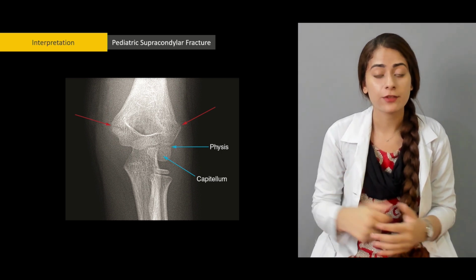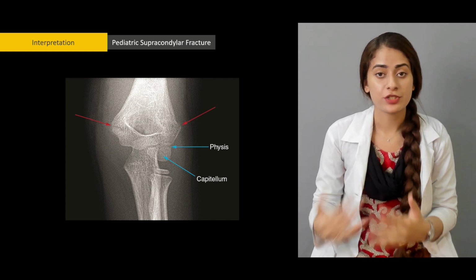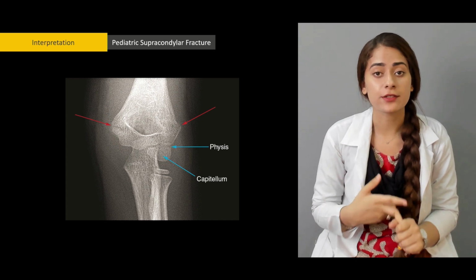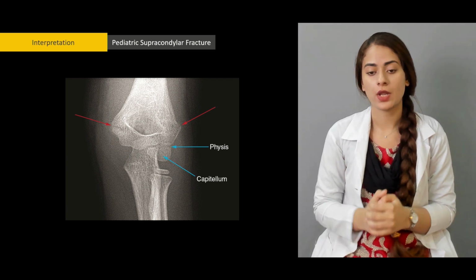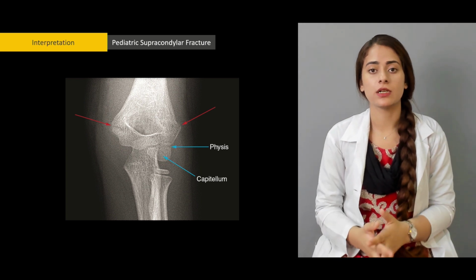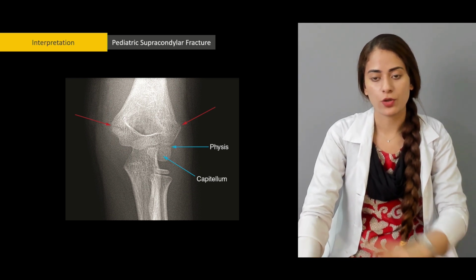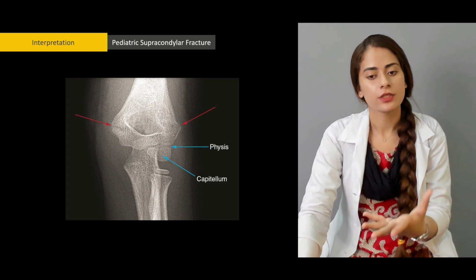So an adult, if presents with an abnormally prominent posterior fat pad, we suspect radial head fracture. So again, radial head fracture in adults and supracondylar fracture in children if there is a prominent fat pad. But to actually confirm the diagnosis, an AP can be asked, and in AP view, the supracondylar fracture will be visible as well. So both views can be used either isolated or together.